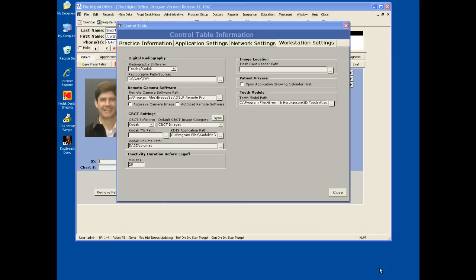If you happen to have volumes that were taken through the trophy bridge from TDO before this integration was completed, these volumes can be synchronized into your patient charts so you can access them directly from TDO. If this applies to you, please contact TDO tech support representatives and they can run the synchronization tool to link those volumes in.